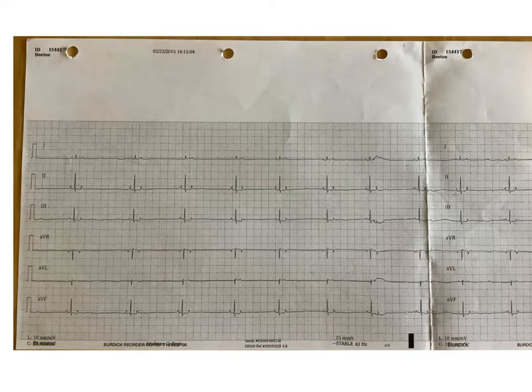We're going to do the same thing on this heart rate strip. We're going to figure out what the heart rate was of BT this time. Again, the first thing you need to know when you're doing a heart rate is the paper speed. This time it's 25 millimeters per second. So every time we move 25 millimeters down this piece of paper, a second is going to pass. We're going to pick another spot to start, why don't we start right here this time? Now we only need to count 25 millimeters until we get to a second. So it's going to be 5, 10, 15, 20, 25.